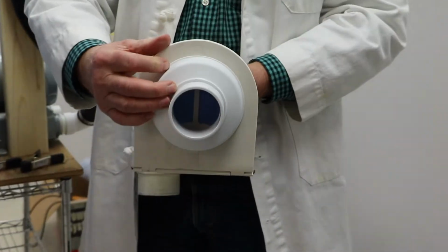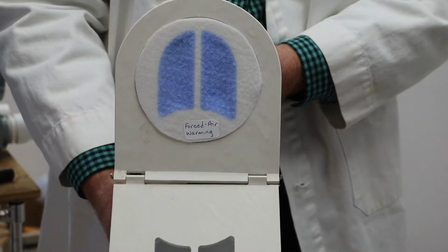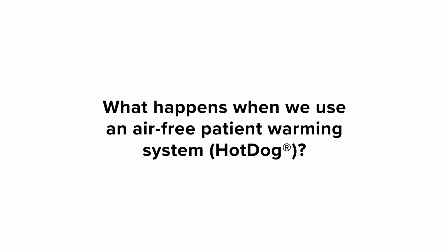The filter is removed to reveal inhaled contaminants. With the forced air system on, the lungs are covered in airborne particles. What happens when we use an air-free patient warming system?